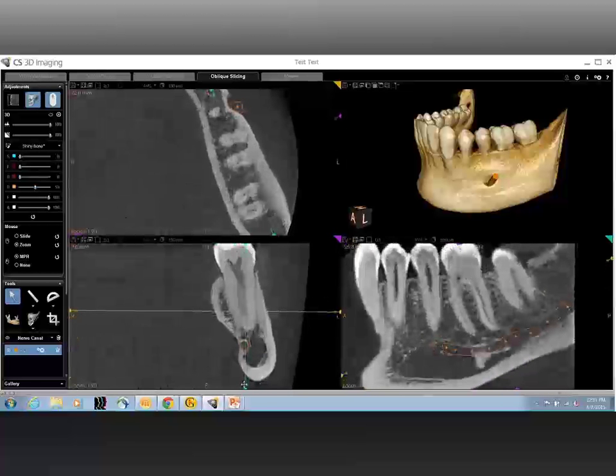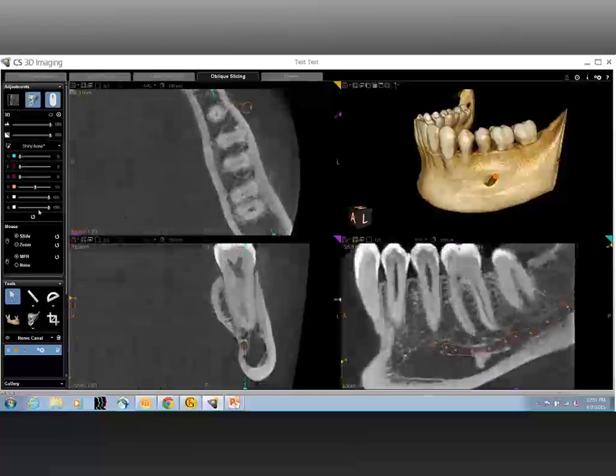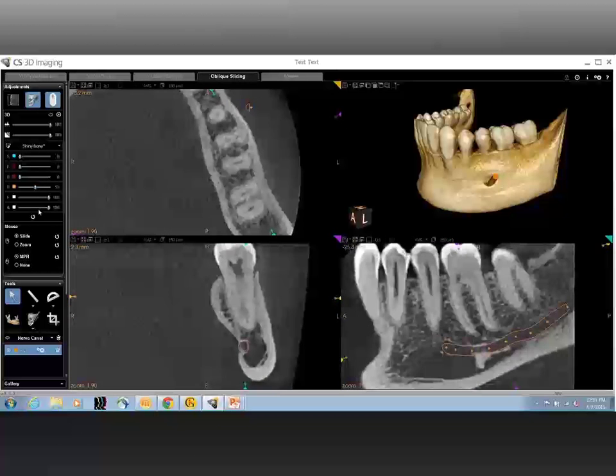to visualizing the canals. You can also visualize it if you look at the axial structures where you see the pulpal horn. If there are any missing canals, you can identify calcified canals or even calcifications within the canal, certain isolated calcifications, pulp stones, or various other things.